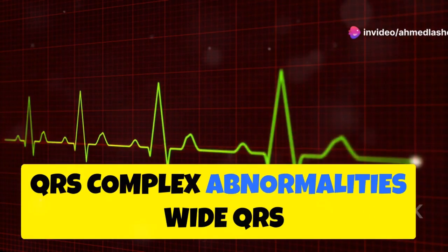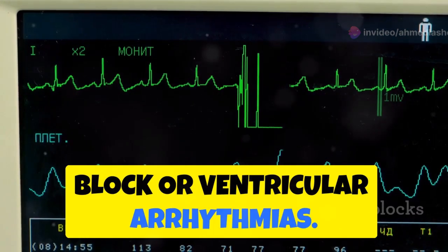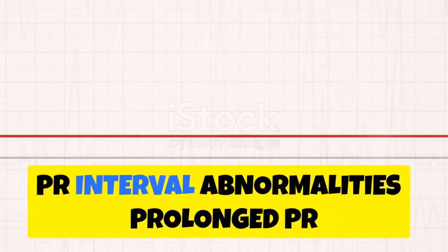QRS complex abnormalities. A wide QRS complex may indicate a bundle branch block or ventricular arrhythmias. Prolonged QRS duration is associated with conduction abnormalities. PR interval abnormalities.